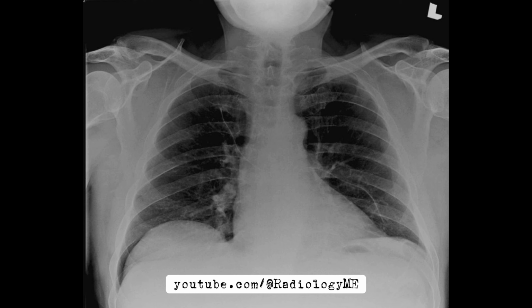What could cause this? Based on the radiographic findings, the diagnosis that comes to mind is a PICC line embolus. Essentially, the line has migrated from its intended position and is now floating in the pulmonary arteries. And wow, that's definitely something we need to act on.